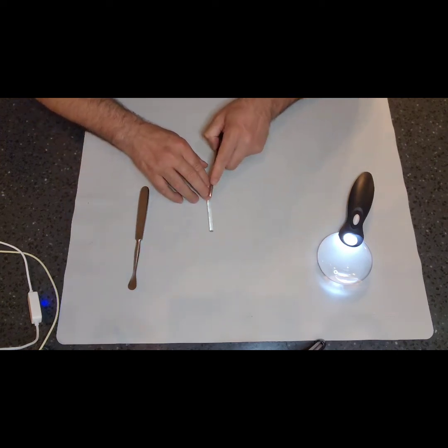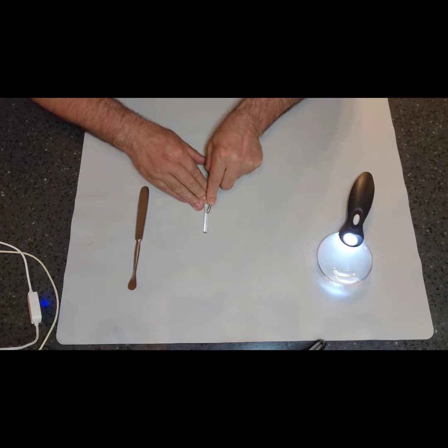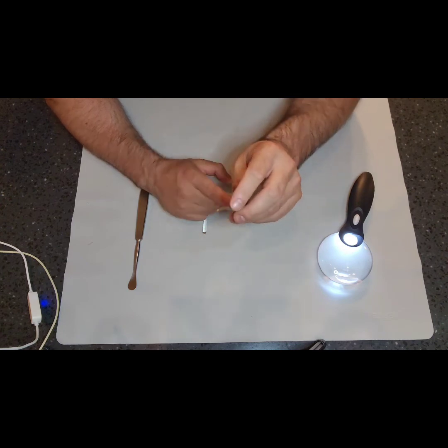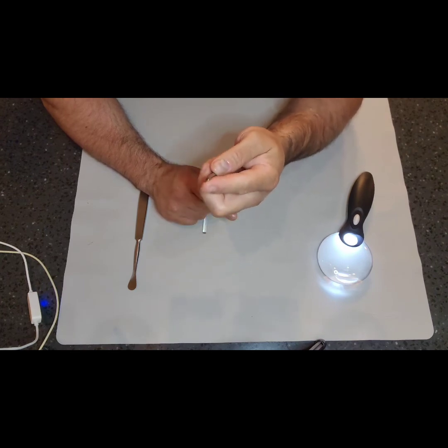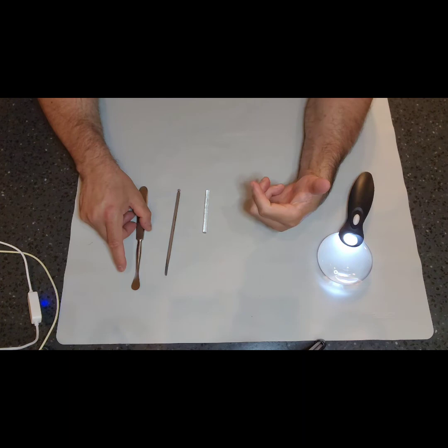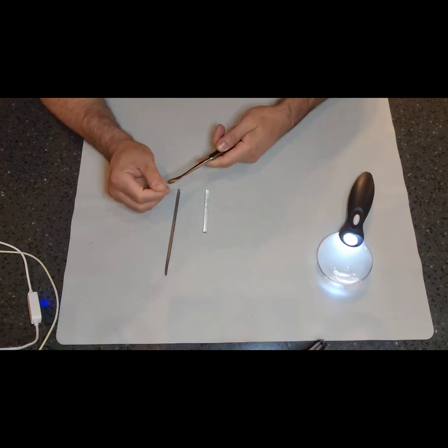Okay, all your elevators, again, away from the body, never towards. This is the rounded edge. You want the rounded edge pointing up towards you and the sharp end flat, and you would bite into a rod and make sure that that is nice and sharp and that is catching, because again, for some surgeries, it's dependent on that sharp edge, right? It's not excessively sharp, but it's sharp enough that it does its job correctly of dissecting and undermining the tissue. So you soil tested it, you did your function test, right? So I made sure it was nice and sharp right there.